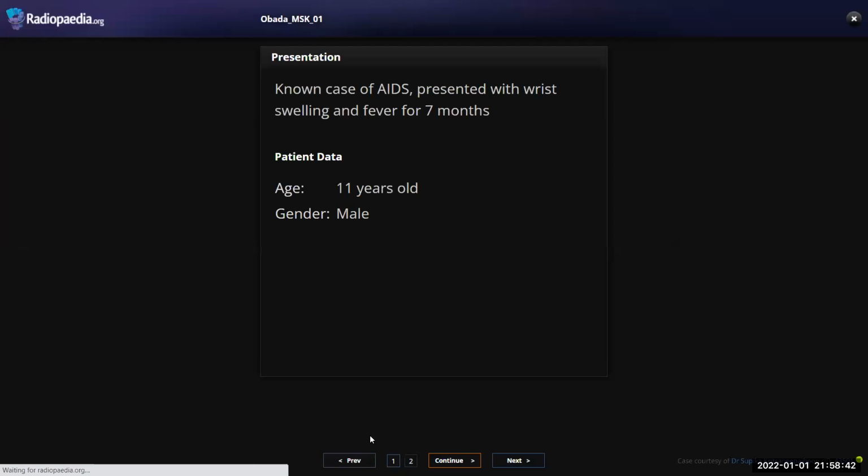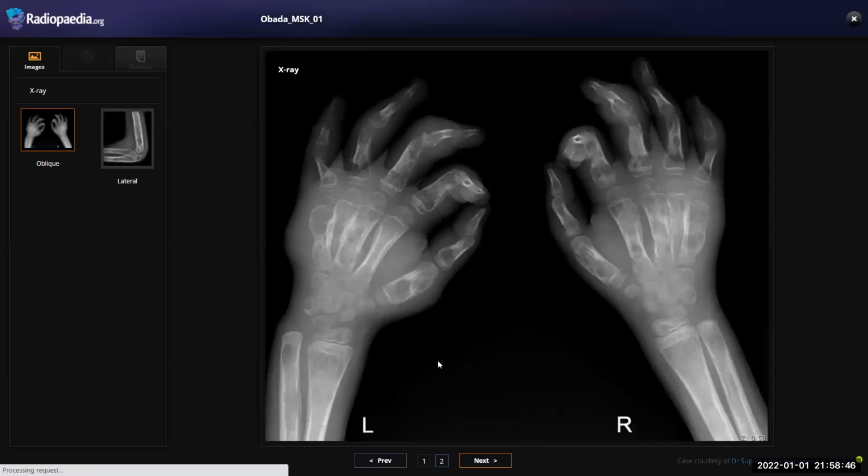The previous case, yeah, this is a tough, rare case. If you somehow see this, it was maybe common a very long time ago when TB was prevalent, but now it's coming back because of HIV and immune compromise. This is a presentation of TB, the musculoskeletal TB.